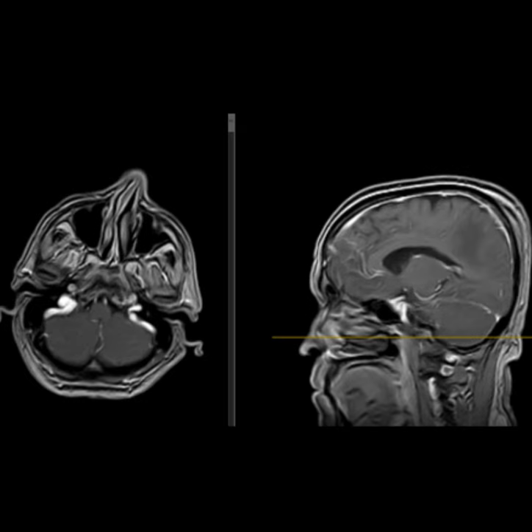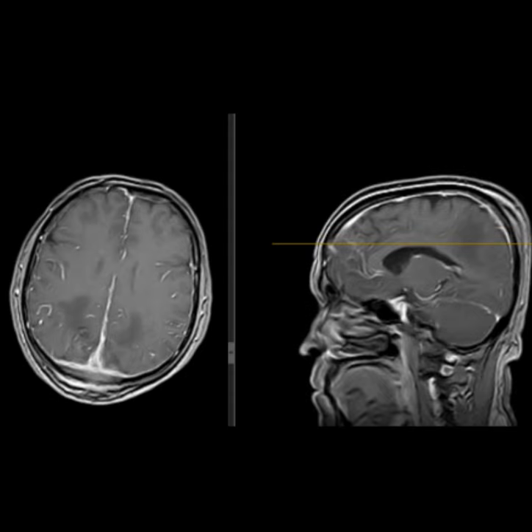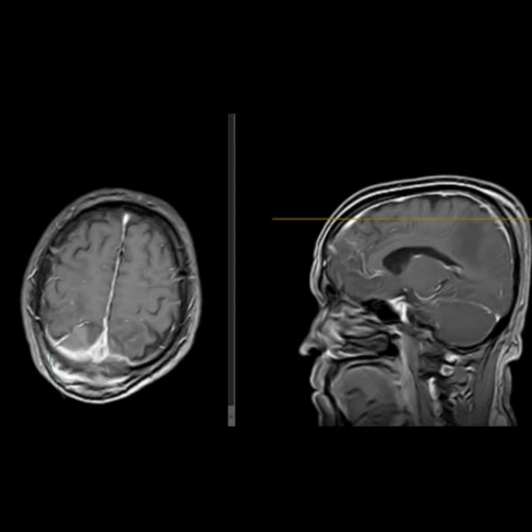And these are your post-contrast images. So this is T1 post-contrast axial images showing that the previously described extra-axial lesion is showing diffuse heterogeneous post-contrast enhancement, and it's centered along the posterior aspect of the falx cerebri, both right and left. So it's encasing the posterior part of the superior sagittal sinus, and obviously it's extending through the skull, both into the subcutaneous aspect, to the intracranial cavity and to the outside.